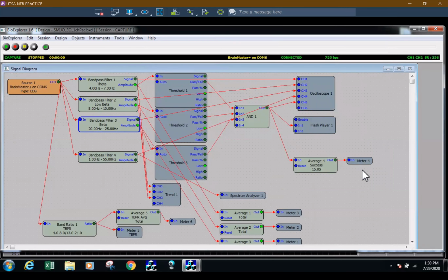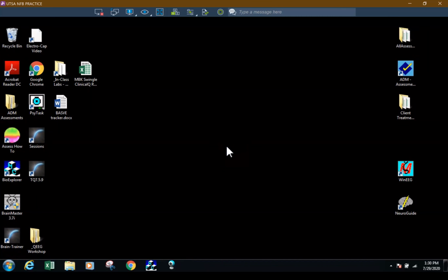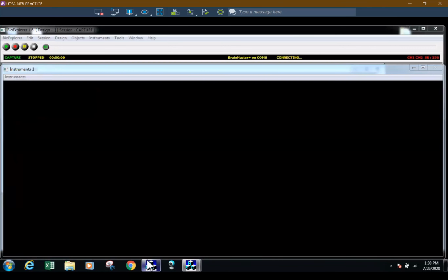All right, so when you go to BioExplorer, let's go ahead and close out and start over from, let's say this is my second session with John Smith. So I'm going to open BioExplorer, and let's say he really liked Pac-Man, and we're going to do the same design all over again.